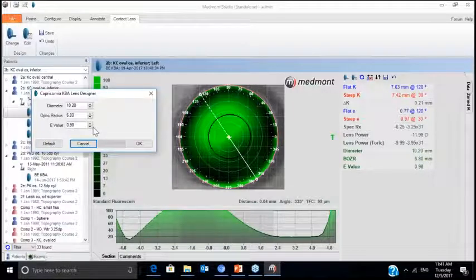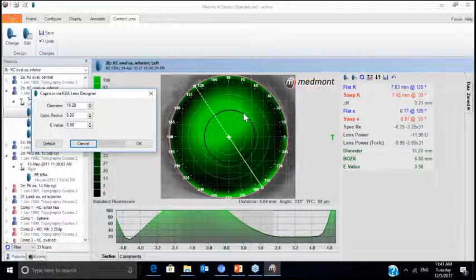So there's some very powerful stuff that we can do with the contact lens software in choosing the right first lens. In this case, the contact lens software says definitely do not fit a corneal GP on this patient. We're going to struggle to create the appropriate alignment. What we might consider is, if scleral just wasn't the option, if the cost was prohibitive, if the patient was going to struggle with application and removal because we had an incredibly deep set eye, then we might consider a piggyback.